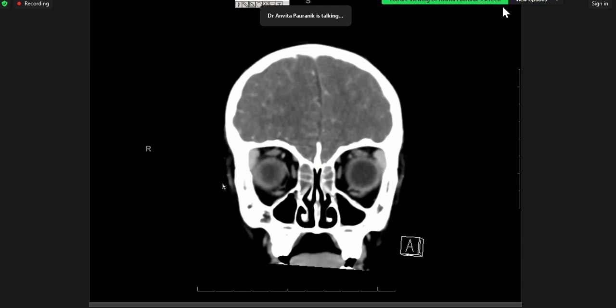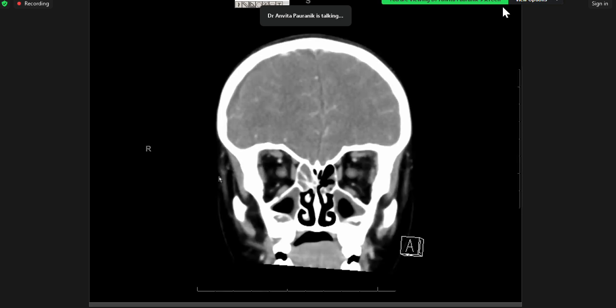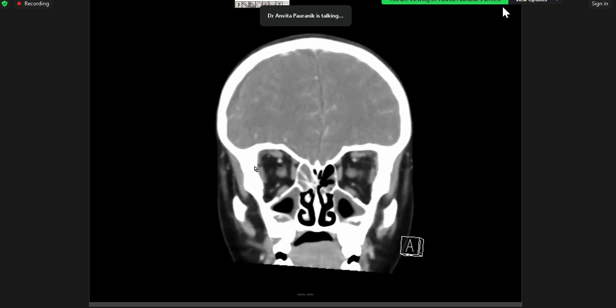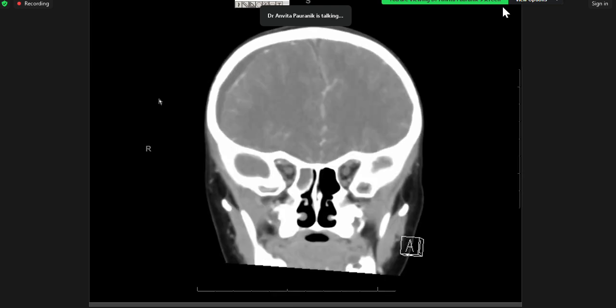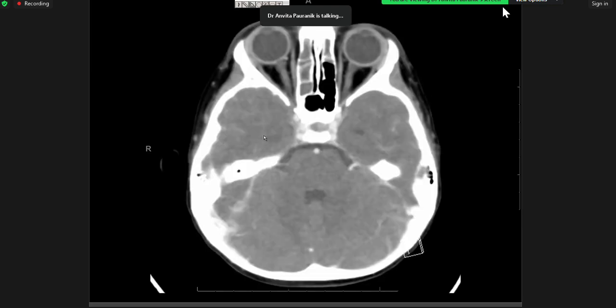I'm not showing you fast-paced, exam-related cases, but what I'm trying to impress upon you from this session is to go slow, go methodical, and pay attention to relevant structures based on the history. So let's say, for infection and paranasal sinus, devise your own checklist. The other things which come to my mind in such a scenario are looking at these structures.